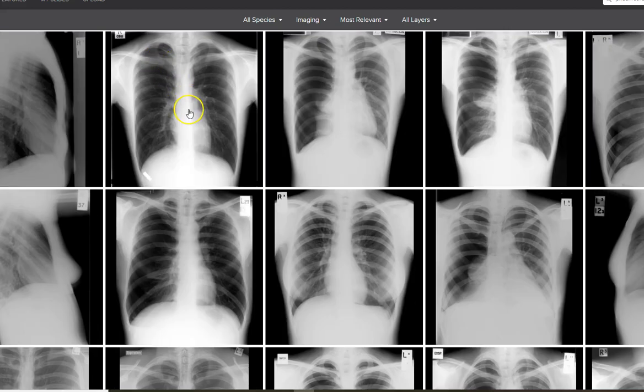And this is what I really brought you here for, just some examples of your contraindications and cautions that are the thing that you really need to be able to spot. So this is a whole bunch of pneumothoraces. You can see lung markings to here, and there's no lung markings at the top. On this one, there's the lung, and then it kind of comes in here, so there's no lung markings on the outside here.